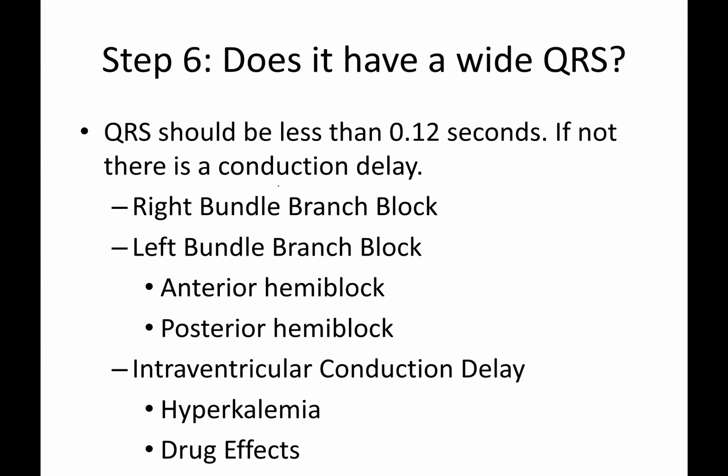All right, welcome to 12 lead EKG interpretation. We're focusing on step number 6, which is does it have a wide QRS or not?